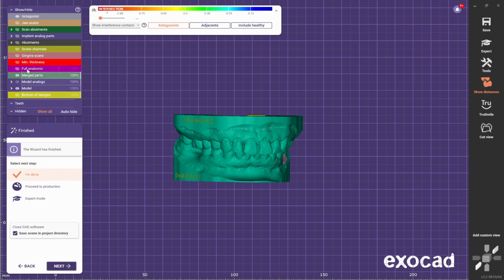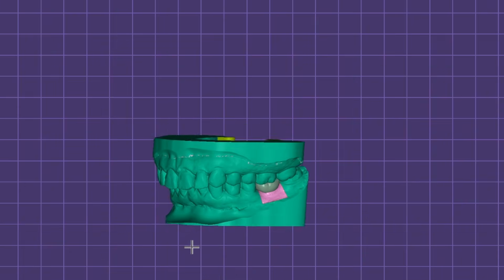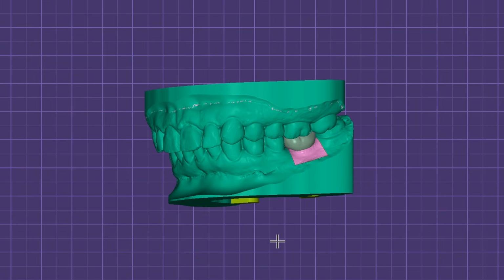You have the full protocol of a single unit on implants. Now, if you want to learn how to do full arches, watch this video next.